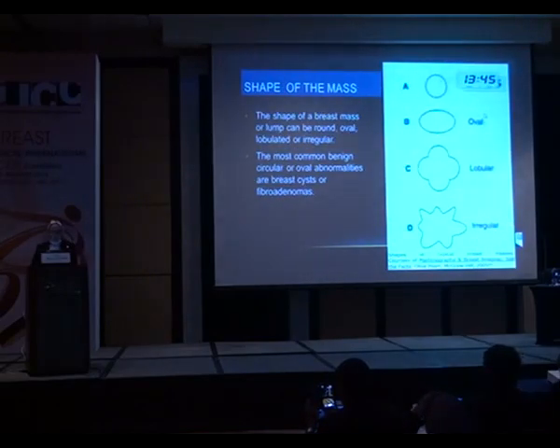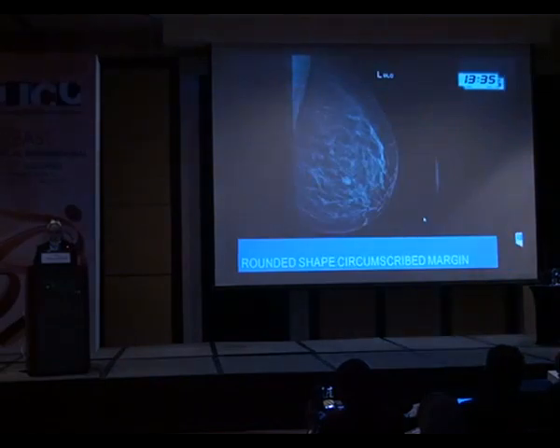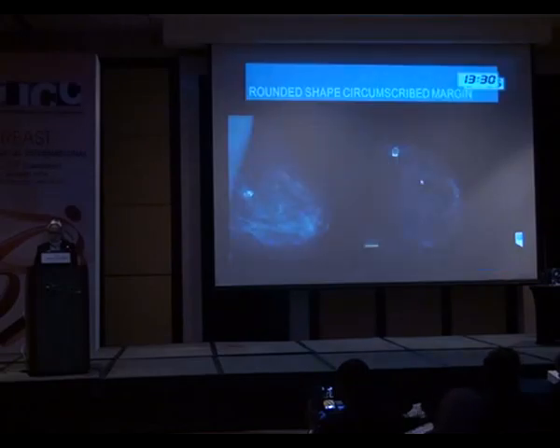And also the shape of the lesion is very important. The well-defined or rounded and ovoid lesion are given to benign lesion. The lobulated is probably benign, and the irregular outline for malignant lesions. These are examples of rounded dense lesion, which is a completely benign lesion.